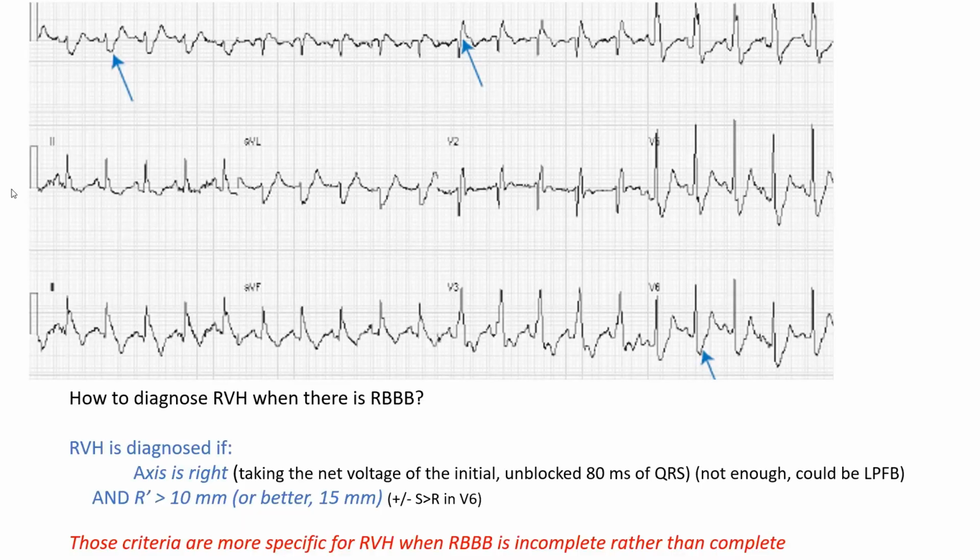The catch, when you have sinus tachycardia, the P wave height increases, so much so that the criteria for right atrial enlargement become less specific. So having a P wave taller than 2.5 millimeters or barely 2.5 millimeters in somebody with sinus tachycardia is less specific for right atrial enlargement than regular sinus rhythm.